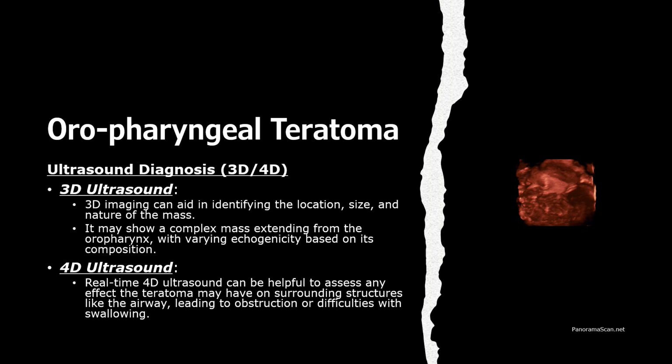For example, large teratomas can cause airway obstruction or swallowing difficulties, which are critical to identify for planning safe delivery and immediate postnatal care. Together, these imaging techniques enhance our ability to diagnose and evaluate this rare anomaly, helping to guide delivery planning and treatment strategies.